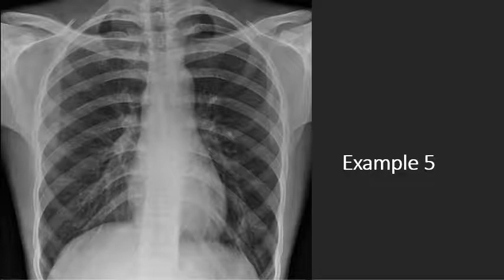So moving on to the rib fracture area here, and I say this because I want you to not pull your hair out about this, but going down ABCDE, we go from our airway down here. Okay, moving up, there's our carina and our trachea, and it's pretty midline, everything's fine. B and our bones, and you can see that we have some little snap.